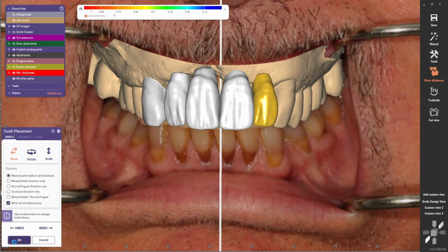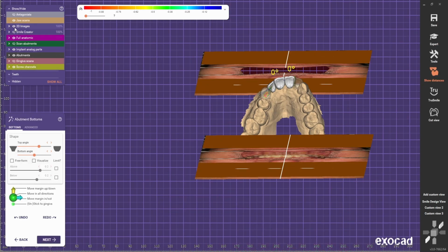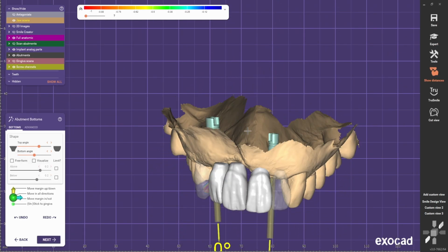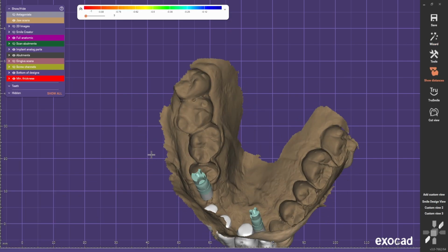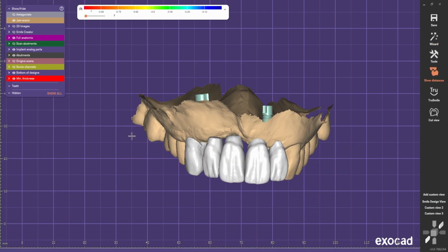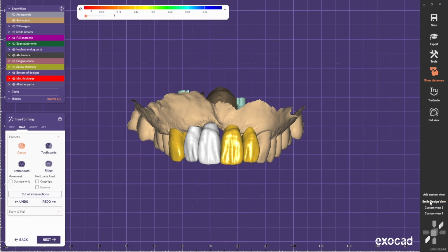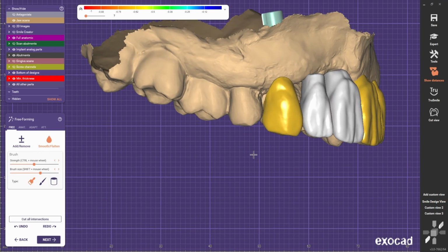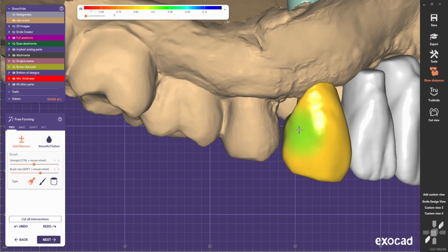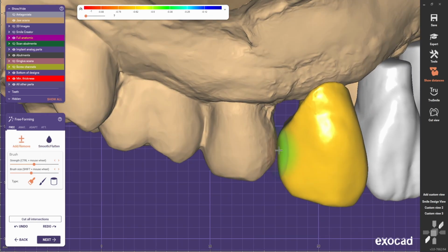Something like this. Close the contacts.